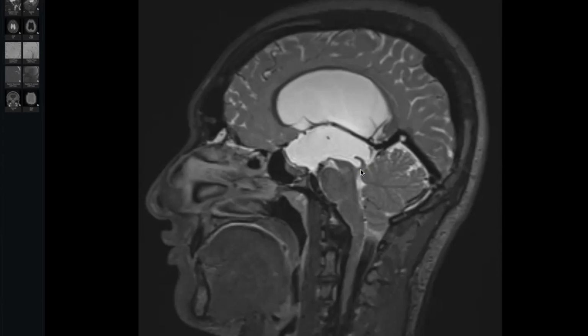So when you have a doubt about stenosis of the aqueduct, look inside. Look anterior, it may be thalamic glioma. Look posterior, it may be tectal plate glioma or mass or metastasis. Look at the pineal region. Four sources of pathology here.